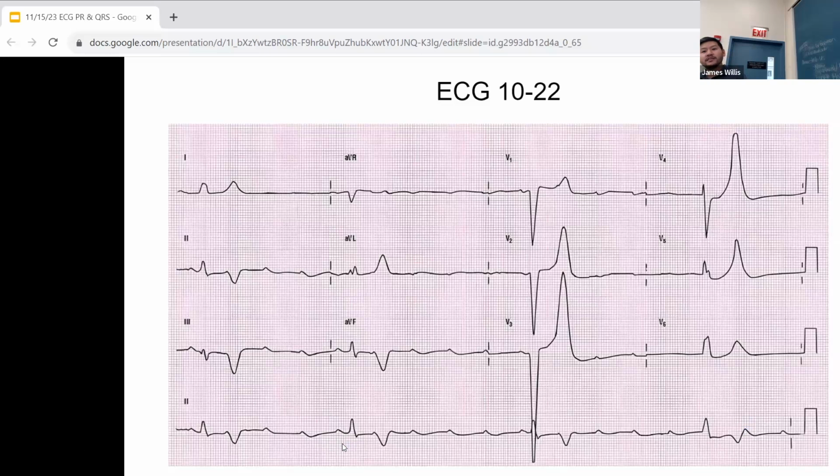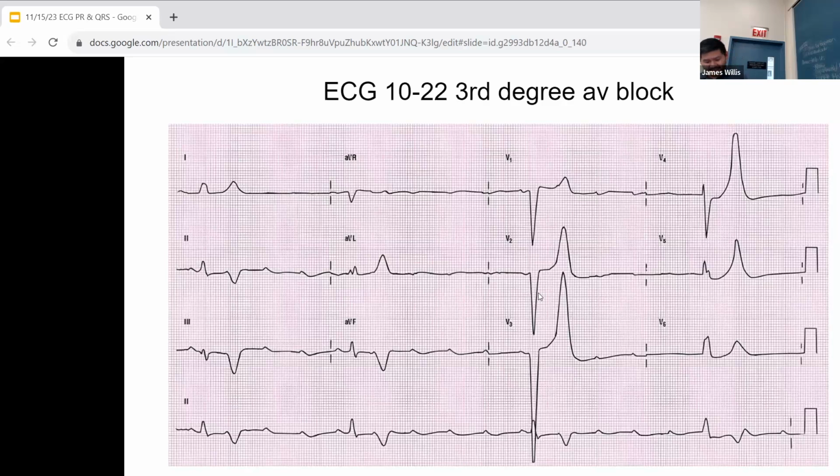It's a pretty common rate for the ventricles to go out when they're switching. So it's probably a ventricular escape rhythm, right? One other thing in my differential, those T waves really bother me too. In the right setting, could this be hyperkalemia causing this heart block? I would give this patient calcium. There's nothing to lose, no harm in it. I wouldn't sit on that. I agree.